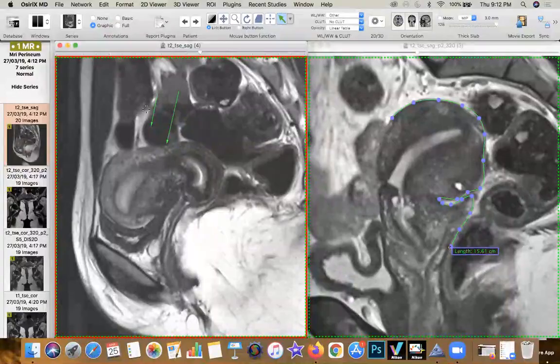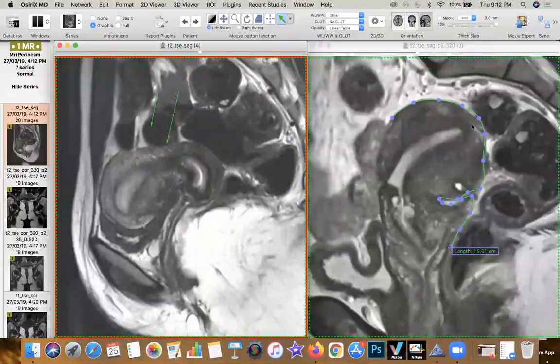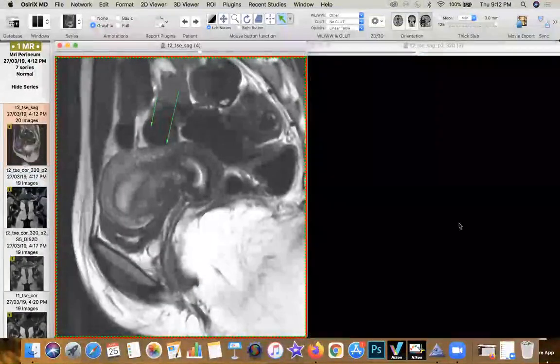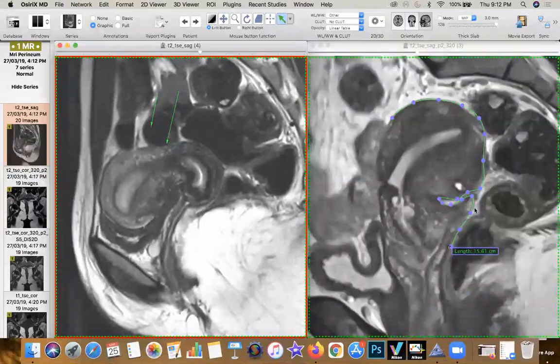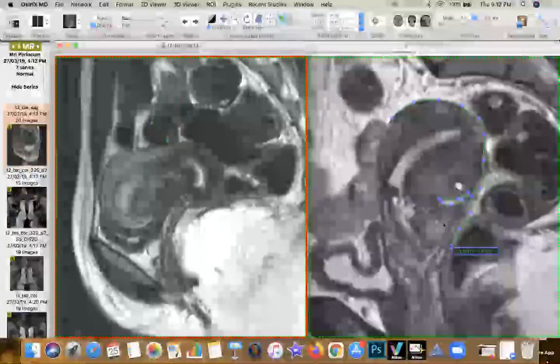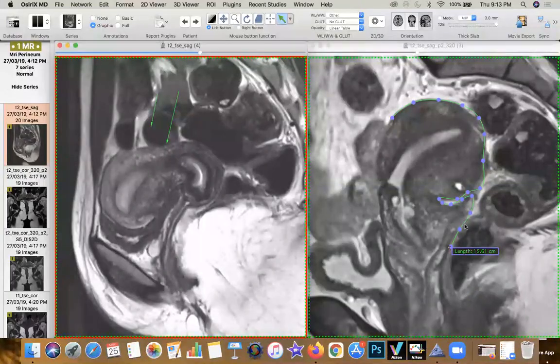And as it's causing this mechanical contraction, it is causing this very unique phenomenon called acute retroflexion or retrotipping of the fundus, along with postero-superior retraction or migration of the posterior fornix. So ideally, the posterior fornix should have been located here. In this case, the fornix is located very, very high.